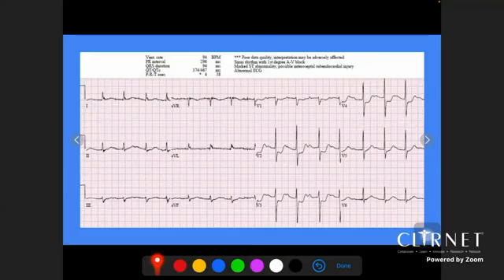Even the machine will label it as abnormal ECG, of course, but some people will call it non-STEMI. If you know that there is something called posterior STEMI, you will diagnose this as posterior STEMI and you will activate the cath lab for this as posterior STEMI. This one, if you did posterior leads, you will find ST elevation only in the posterior leads, and here is the trick.